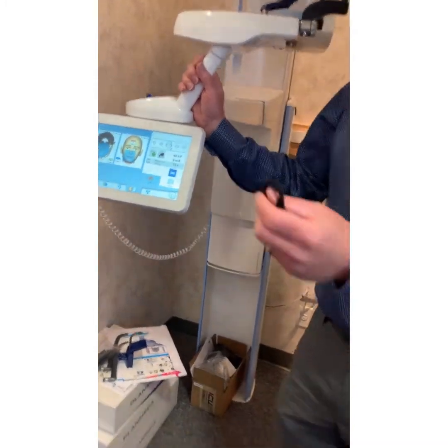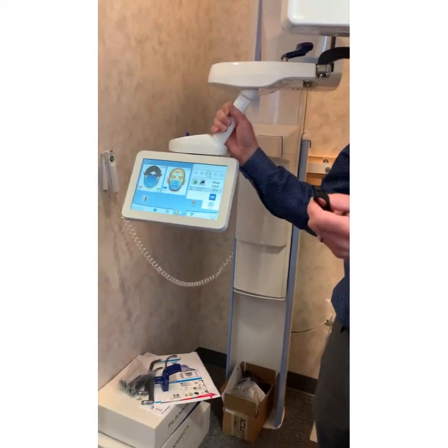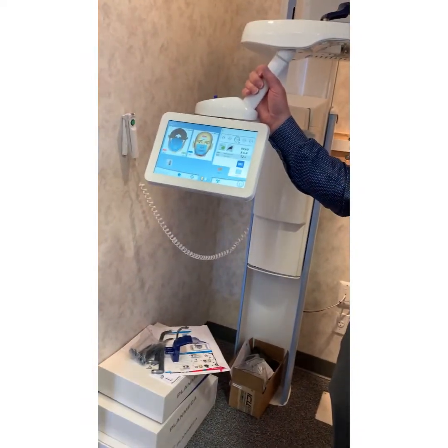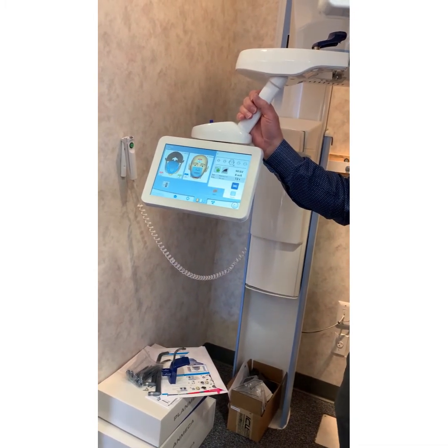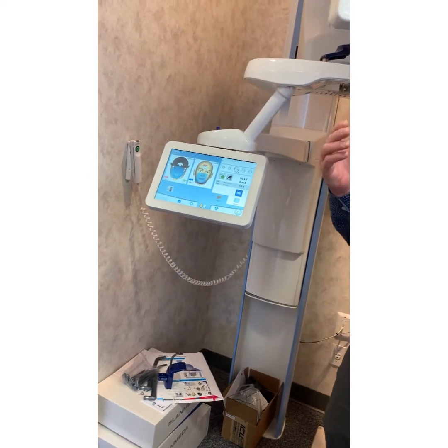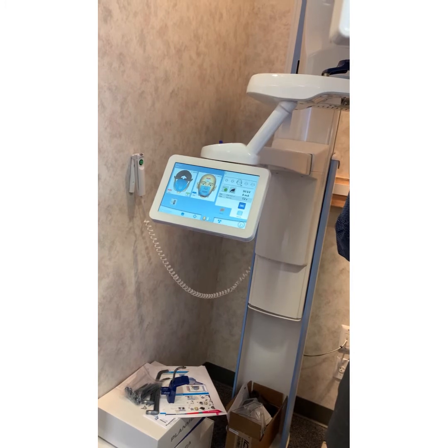And when I say it, I think I have this discussion at least once or twice a year. I'll have an endodontist tell me that you can't see root fractures with 3D, even though I've shown many examples. That's just a display of what the root fracture would look like with 3D. I've got lots of examples of vertical and apical fractures that you can see with 3D pretty clearly.